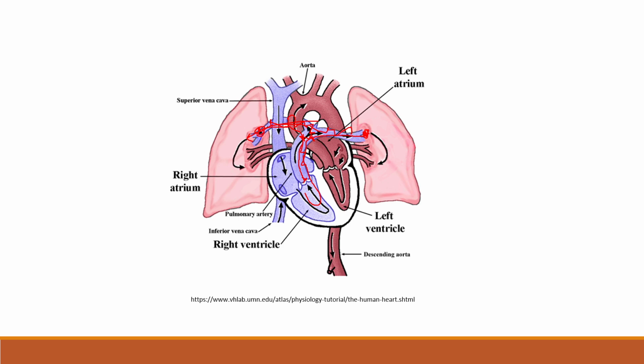So it increases the strain on the right ventricle, and it causes RBBB. The bundle goes like here, and there's going to be some blockage here, and this is RBBB. It's very easy to understand.